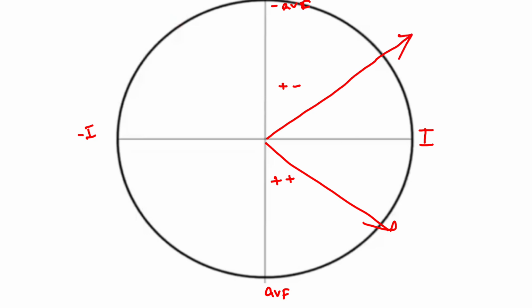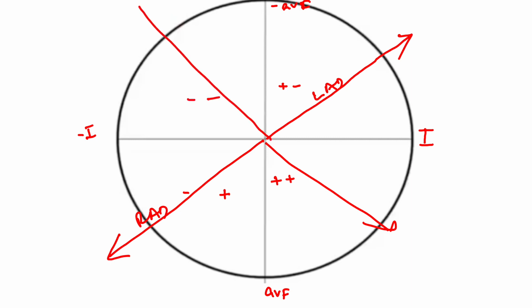When lead 1 is negative and AVF is positive, then it will be a right axis deviation. When both lead 1 and AVF are negative, we call it an extreme axis or northwest axis deviation.